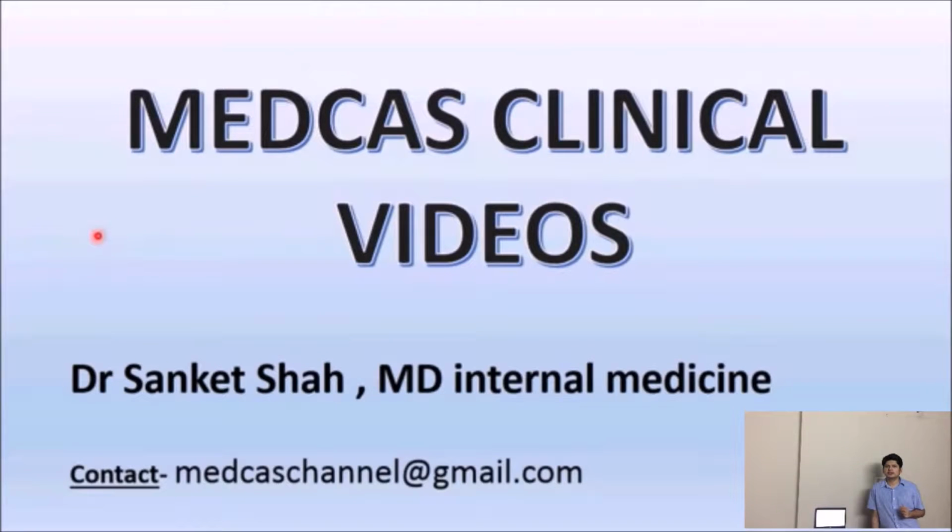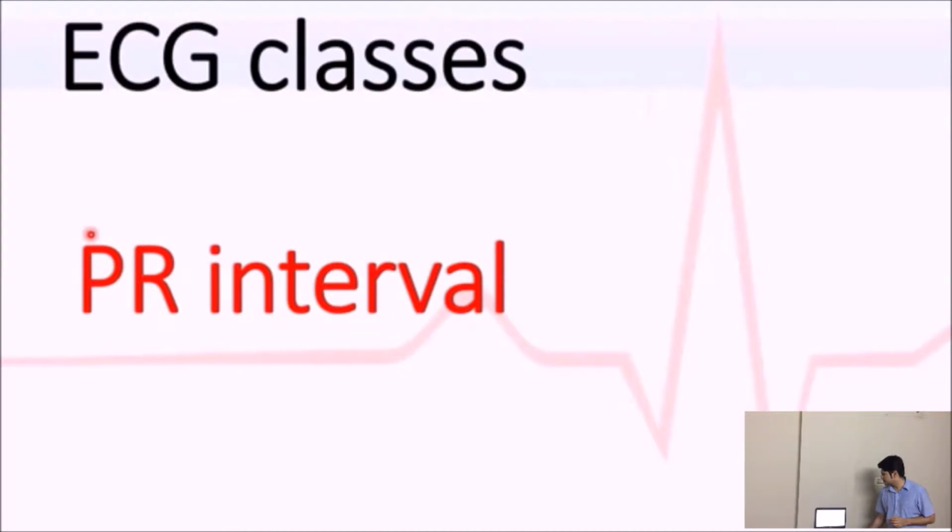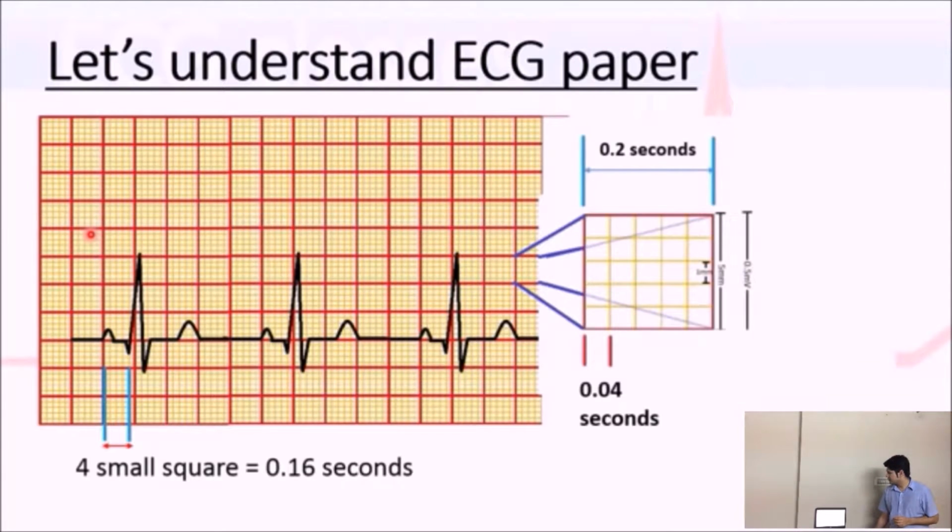So on the whiteboard we have understood about the PR interval and the physiology through the AV node. Okay, now we are going to understand the real-time ECG for the PR interval. So today's topic is PR interval. First, understand what the PR interval is with this ECG paper.